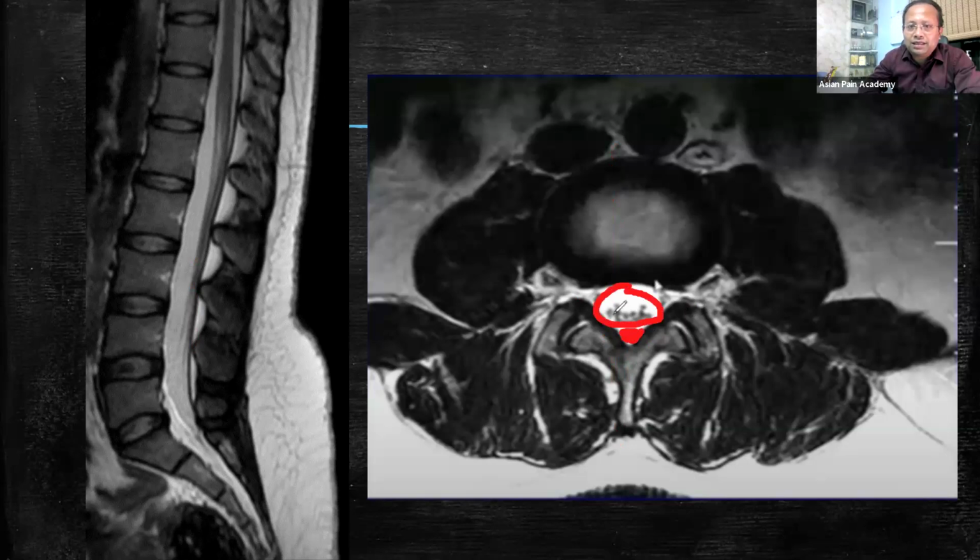Now, what are these small dots? These are the cauda equina roots, hanging in the CSF. Now, remember, since our sacral foramens are all posteriorly placed, these roots are sacral roots, and since the lumbar roots are sidewise placed, these roots are lumbar roots.